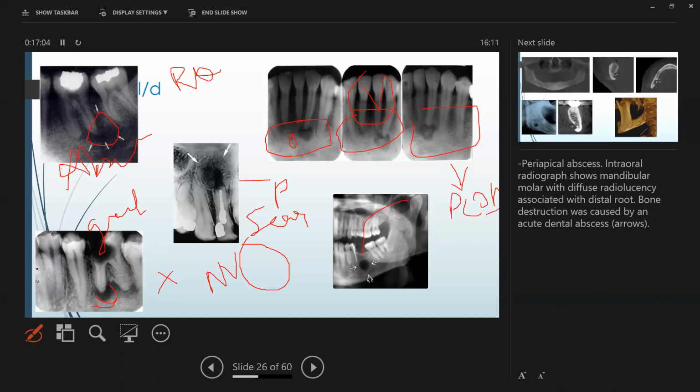Okay, PCOD. And this one is maybe the tooth was there, okay, and the cyst was not completely enucleated. So the tooth is out, but the cystic lesion or the lining is still intact. So that's a residual cyst.